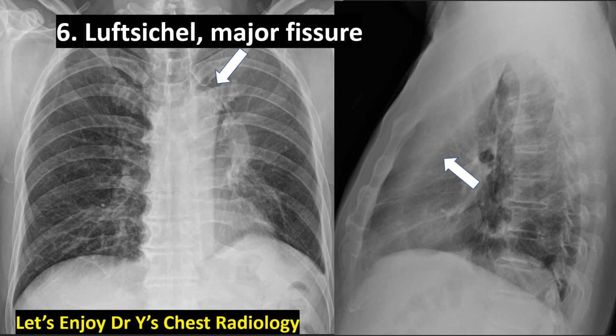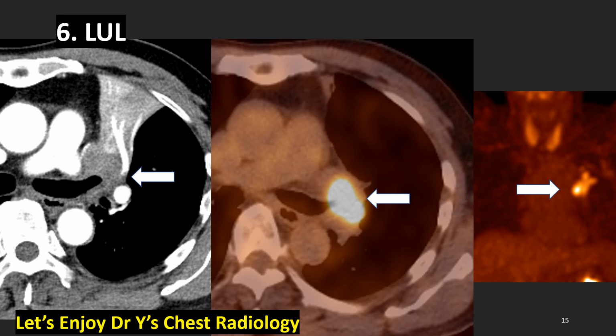Also, we do not see the normal round left upper lobe bronchus on the lateral film. We only see the round opacity of the right upper lobe bronchus. These axial images all show a left upper lobe mass about 3 centimeters obstructing the left upper lobe bronchus and the distal lobar collapse.